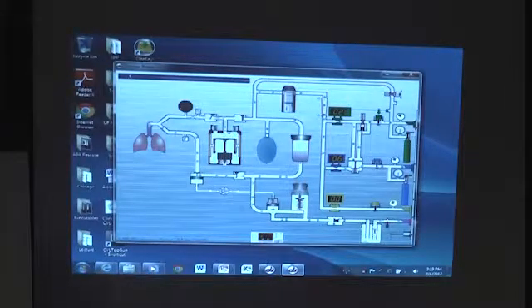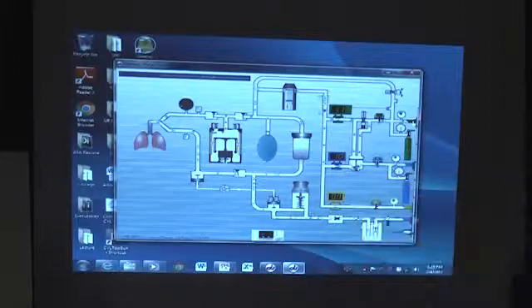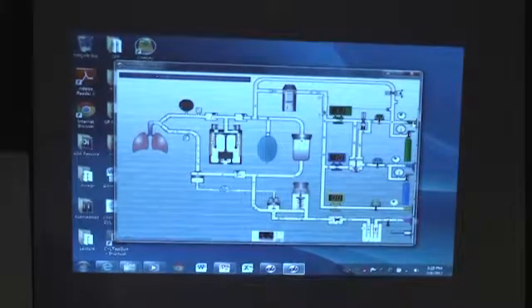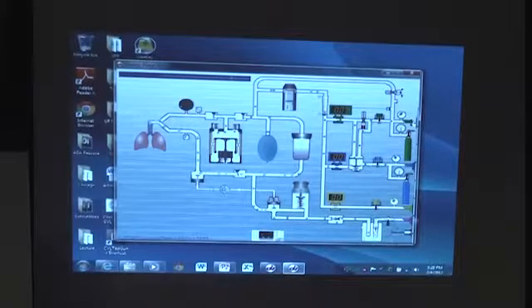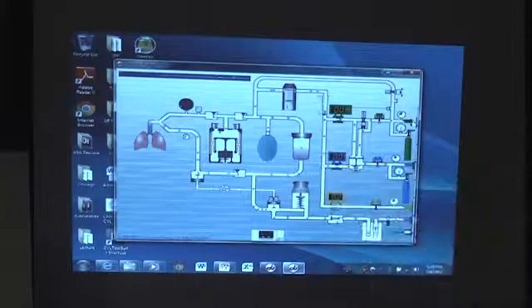Similarly, if I were to completely lose the pressure in oxygen by disconnecting this pipeline, you can also see how the spring then, because there's no more pressure on the top, would just push up and shut off the nitrous. So that's the fail-safe. So in the Draeger design, the fail-safe and the proportioning are in the same unit, right? But you can also see how that would not protect against the gas in the oxygen pipeline actually not being oxygen. It's all based on pressures and the assumption that there will always be oxygen in that pipeline.